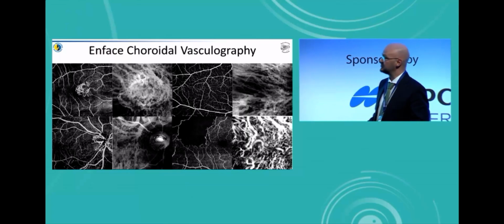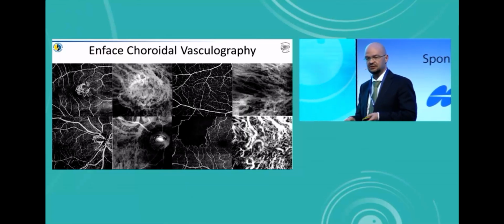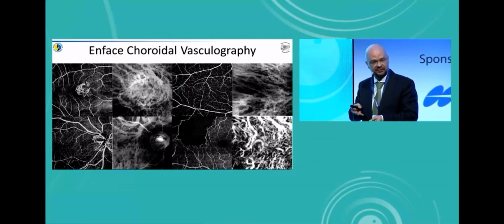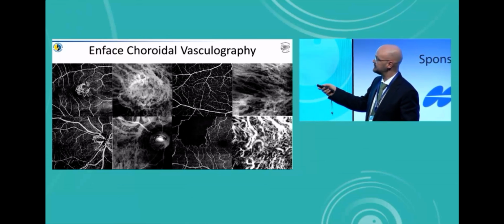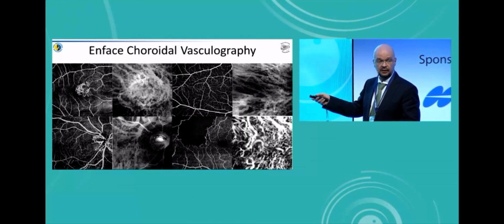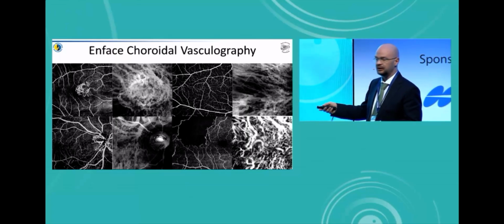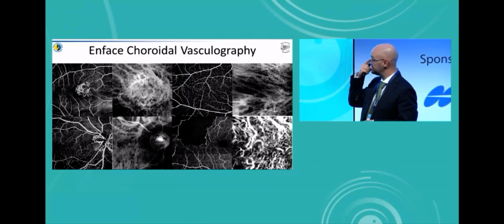But what I did was take a look at the segmentation of the choroid. I went down past the choriocapillaris and into the choroid, made the slab a little thicker, and I inverted the image. And when you do that, you suddenly get these areas that in the normal image are dark. These areas are suddenly white. And they start looking very, very familiar, very, very close to an image you might see in an ICG.